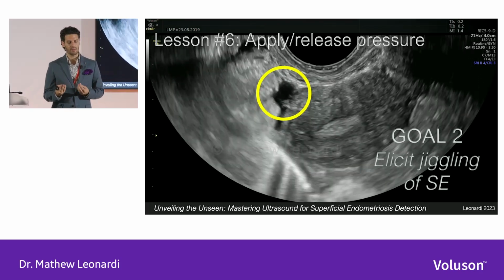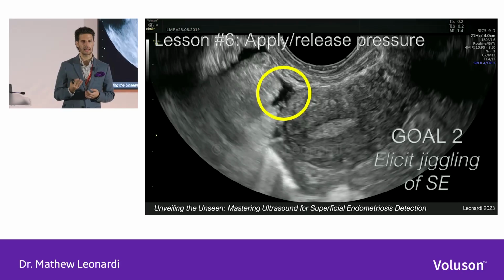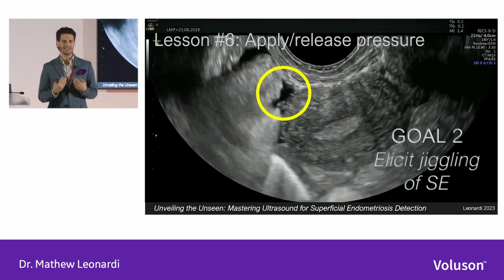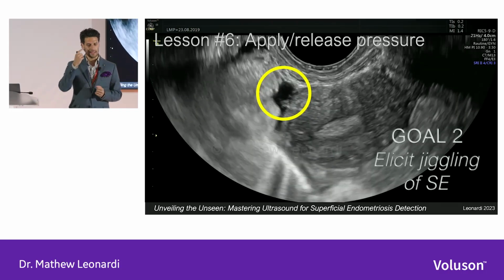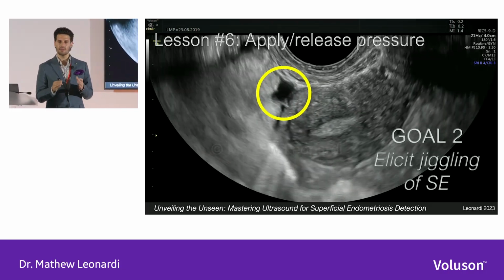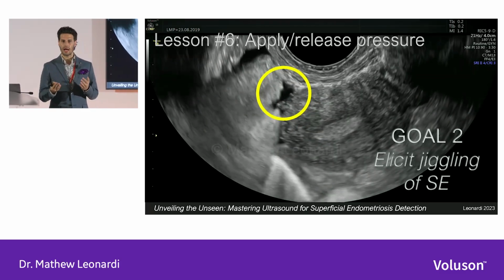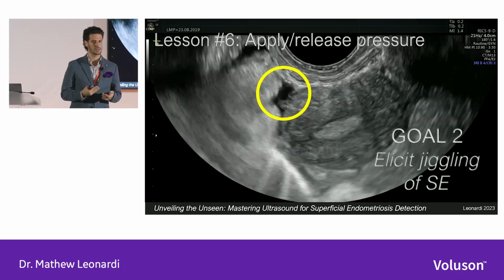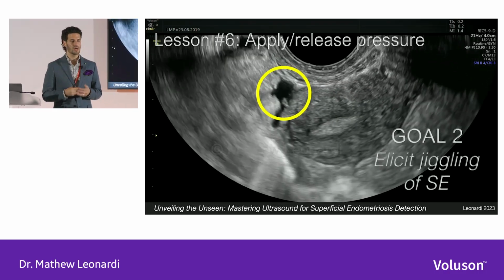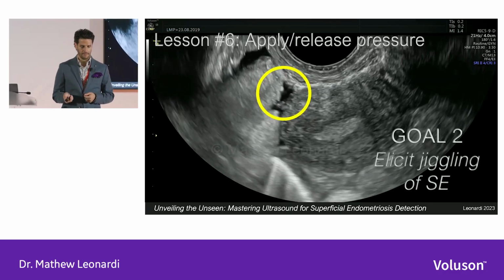In cases of people having a history of pelvic inflammatory disease, you want to keep in mind that adhesions can form, but that's really the only other pathology, infectious etiologies, that can elicit this particular feature. Some of the other features like hypoechoic irregularities or interruptions could hypothetically be secondary to previous surgery, and as we know, a lot of endometriosis patients have multiple surgeries, so you do want to have that context in mind as well.